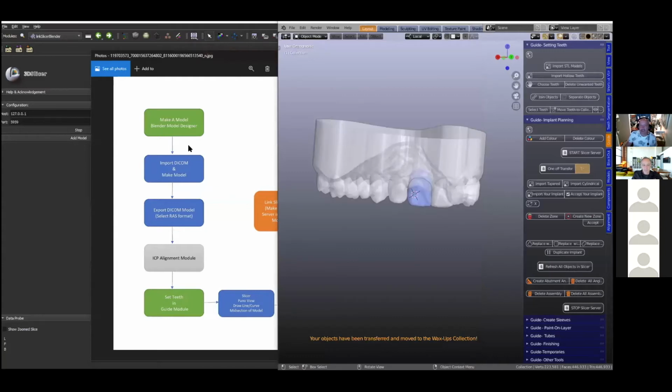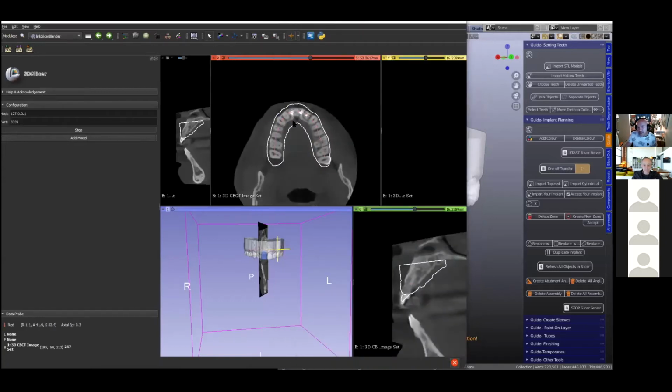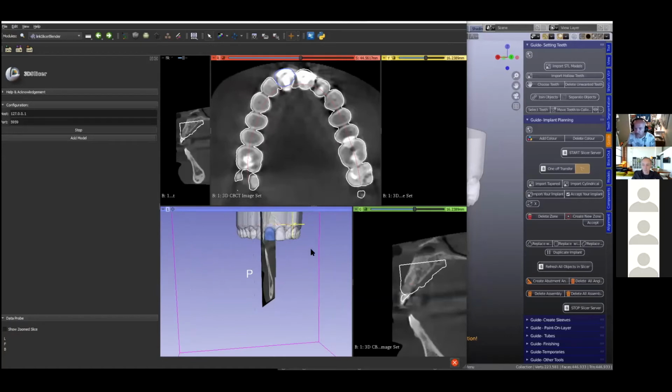So everything has been set up, and we're going to give it a once over to check that this indeed lined up according to our scan. And if I look at it correctly, bingo, we've got a very nice alignment. Now this is extremely important because if this doesn't align correctly, the implant is going to be way off. We're talking about surgery here, and we can't muck around. So it's very important that the model coincides with our implant. All right, so I've got a very nice alignment, and we can see it over here as well.